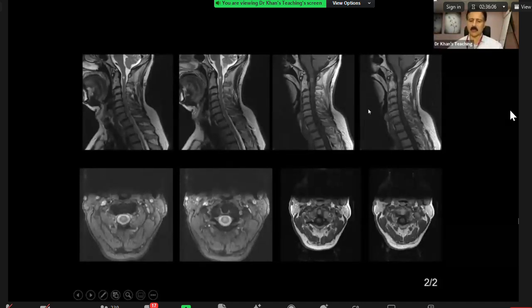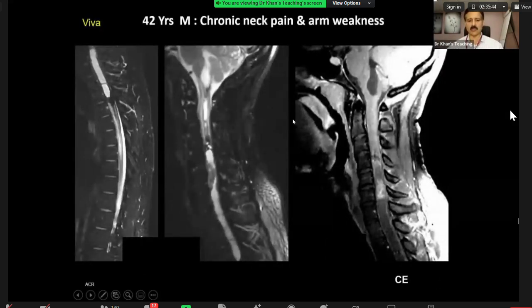They can have a cystic component at times, a very long segment cystic component. So here, the top differential will be a tumor, and as in the first case which you saw, astrocytoma will be up there. Ependymoma is less likely or unlikely because of lack of hemorrhage, as you pointed out in the previous case. Okay, over to you once again.